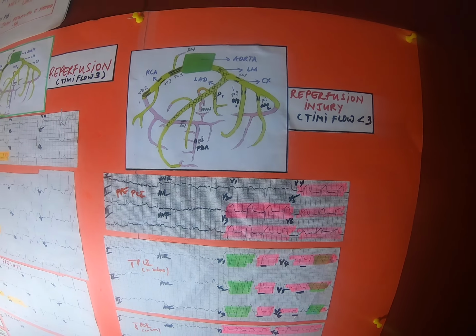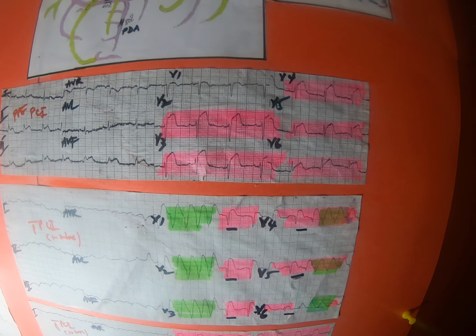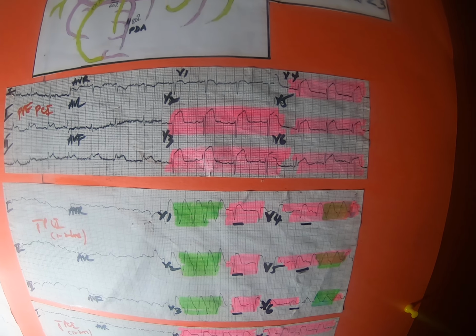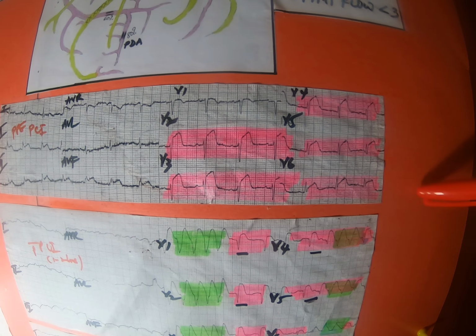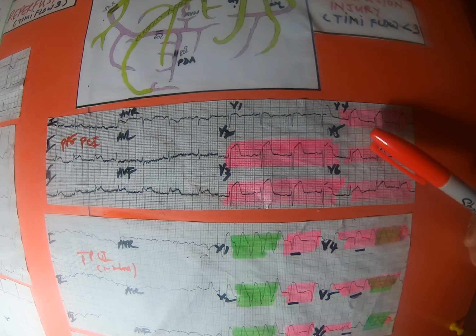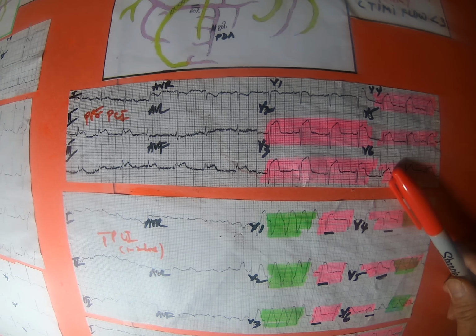Okay, I'm back. This is reperfusion injury. We have a patient that came in with a late anterior STEMI. Why did I say late? Because you already have Q waves here, ST with Q waves, V2, V3, V4, 5, and 6. This is a late presentation anterior STEMI.